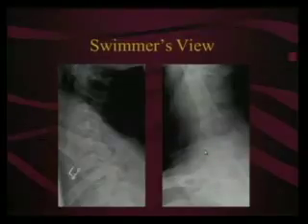Would you really want to say that there is no non-displaced pedicolaminar fracture on this patient? Okay. So I'm not a huge fan of swimmer's views. We get them because we do a complete C-spine study, but I read them with a lot of trepidation because one of the areas where we see cervical spine fractures is at C5-6, and we see it posteriorly. We see pedicolaminar fractures at C5-6 all the time. These are unstable fractures. If they are not diagnosed, the patient could end up partially paralyzed. So that's something that we really want to evaluate and look for.